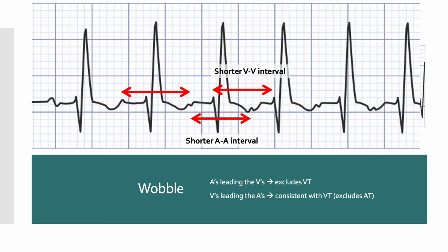Also note that if the opposite is true, if the V's are leading the A's, this will be consistent with VT, although there are SVT mechanisms that this can be explained by.